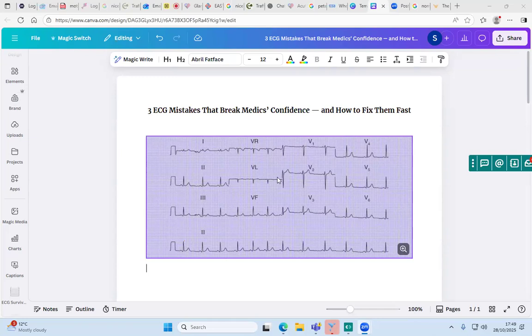So what is my diagnosis of the ECG? Before I say my diagnosis, I have to know the context, especially as this is not an exam. There's a real patient in front of me. Where is this patient? How old are they? Why have they done this ECG? Are they in pain? Do they have cardiac chest pain? In this case, I think the patient is young, maybe in their mid-30s, and they've come in with pain that is not cardiac sounding, is not constricting in nature, not brought on by activity, not improved with rest, worse on movement in the lateral aspect. Sounding musculoskeletal, isn't it? This ECG is sinus arrhythmia.